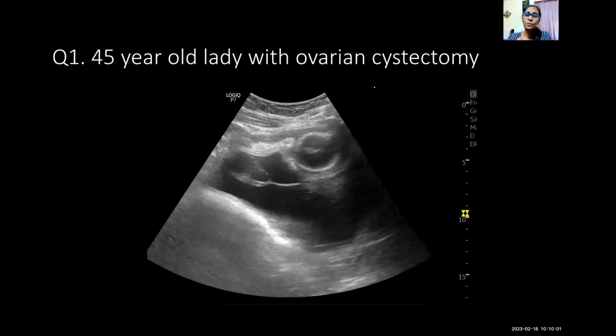So this is a 45-year-old lady who had previous ovarian cystectomy. It was a benign lesion. This is an ultrasound of the abdomen, transabdominal ultrasound. This is done of the pelvis. Just to give, I've used static images to make our discussions more targeted rather than generally we have a whole series. I can just orient you. So that is a Foley's catheter in a collapsed bladder.